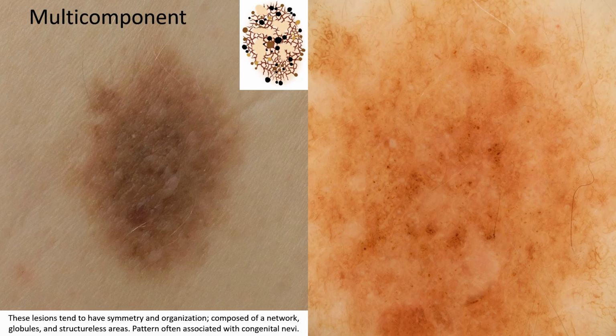Finally, a congenital nevus which shows you dramatically the numerous milia-like cysts, and see how nicely they're seen in the near ultraviolet light.